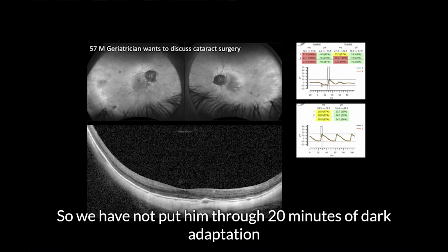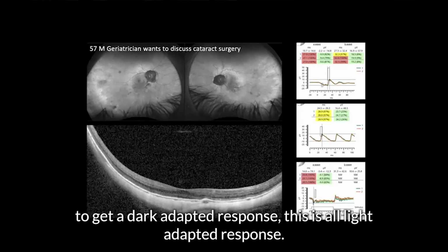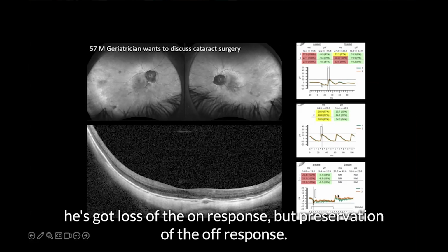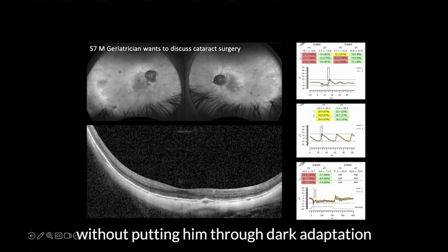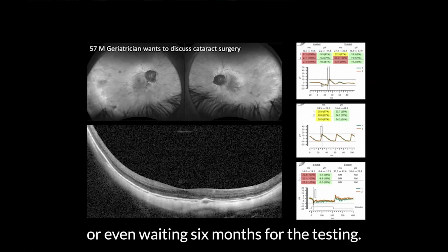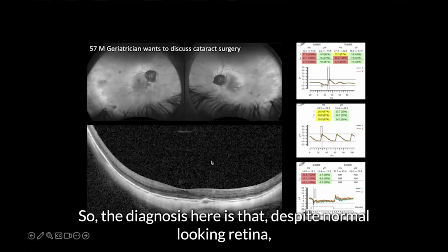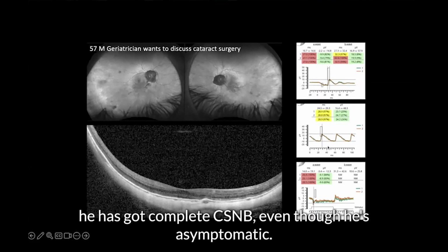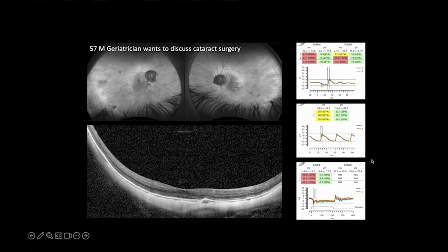So we have not put him through 20 minutes of dark adaptation to get a dark adapted response. This is all light adapted response. And we can see that on the on and off response, he's got loss of the on response, but preservation of the off response. Based on this pattern, we've got a diagnosis for him without putting him through dark adaptation or even waiting 6 months for the testing. So the diagnosis here is that despite normal looking retina, apart from the myopic change, he's got complete CSNB, even though he's asymptomatic. But after further questioning, he says he did have difficulty seeing in the dark for many years.